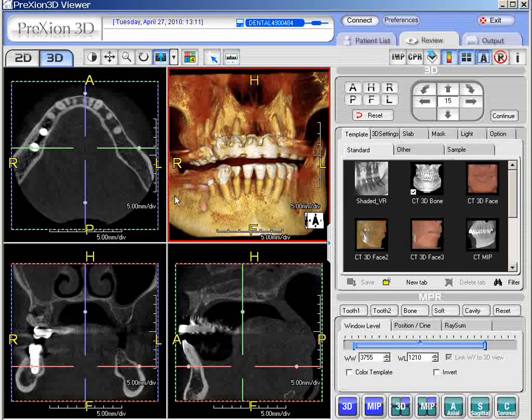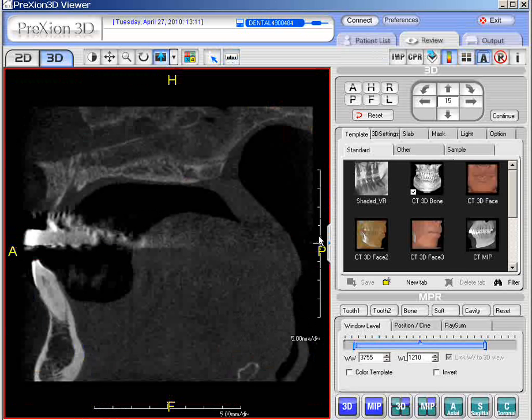Now, you also have the ability to take a calibrating. Notice that there's calibration marks with all of the images, and what we could do is just double click on one to load. You can actually grab the bar itself and scroll over the bar and put across any area to determine what your measurements are. On the bottom you can see each of these individual divisions is 5 millimeters. So this is a 5 millimeter portion here, this is 5 millimeter portion here, etc., etc.